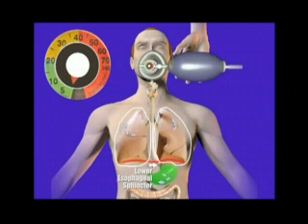Problems arise when delivered breaths are given at pressures in excess of the lower esophageal sphincter opening pressure of approximately 20 centimeters of water. At these high pressures, a significant portion of each breath is diverted from the lungs to the stomach. This well-documented occurrence is referred to as gastric insufflation.